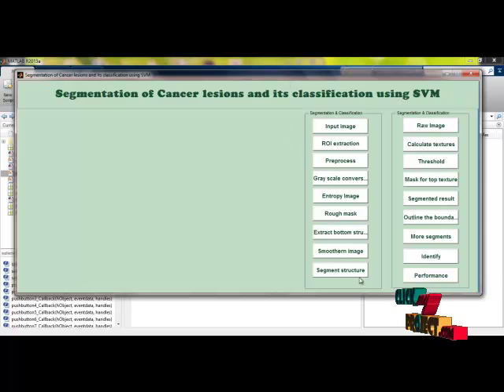Here a number of push buttons are located. Each push button has corresponding code in its backend. Every button is processed with backend code. While we are pressing any button, it will call the process which we have located in the GUI framework, with its corresponding .m file.